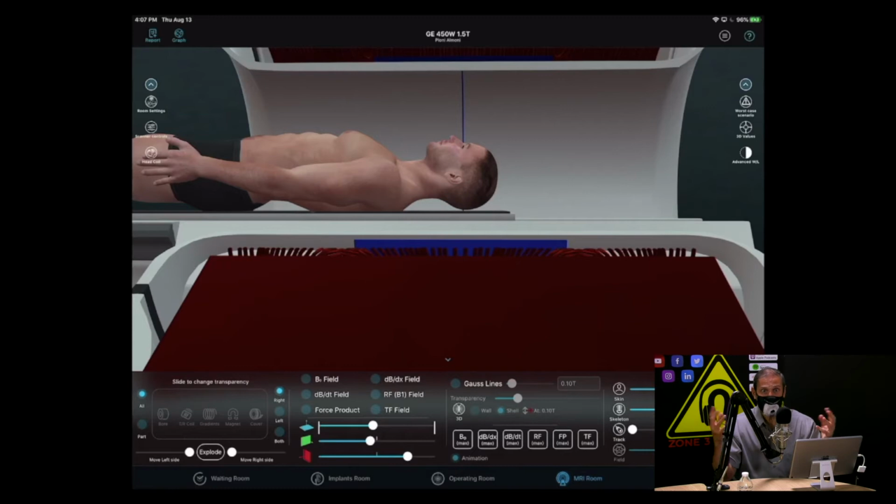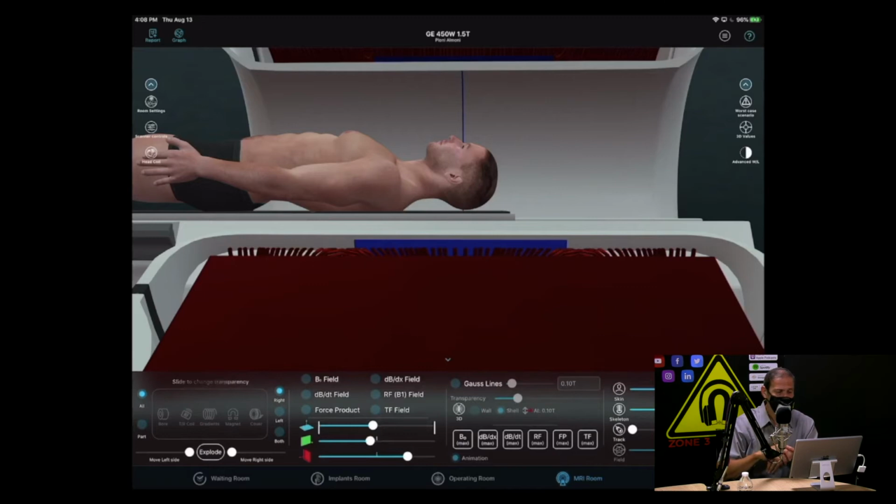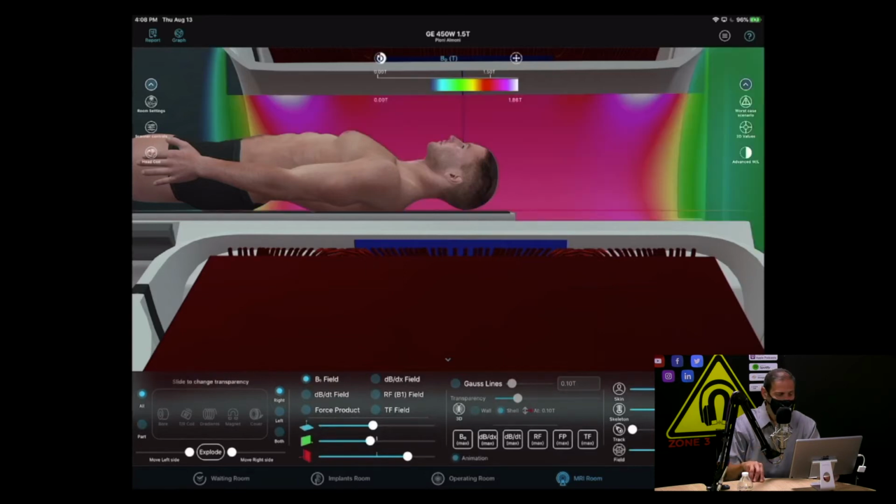Well, they're invisible. That's why we call this MagnetVision, because it's trying to take the invisible and make it visible. If you look at the scanner now, in the image in front of you, there's a hidden drawer underneath, the bottom quarter of that image, that comes up. Here, I'll make it come up again. That drawer has 4 different panes. The second pane has all these fields in it. B0 field, I'm going to press on that right now, and that's the static magnetic field. This is, three-dimensionally, the static magnetic field color-coded of that MR scanner.